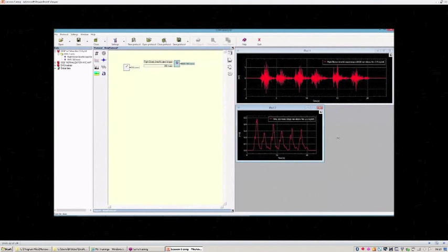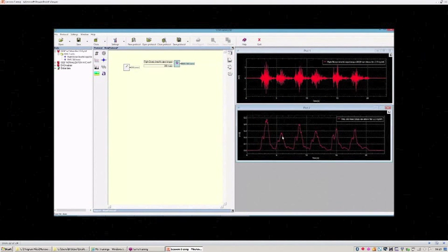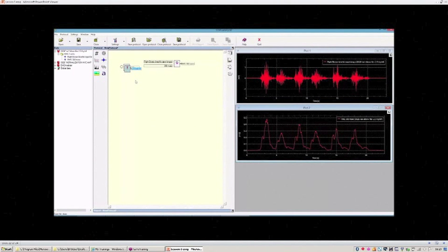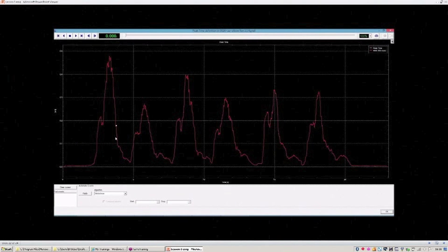So imagine now that we want to normalize the envelope of the signal with respect to the peak value, so with respect to the maximum. First we have to identify the time events which correspond to the instant when we have the maximum of the signal. This is the peak.